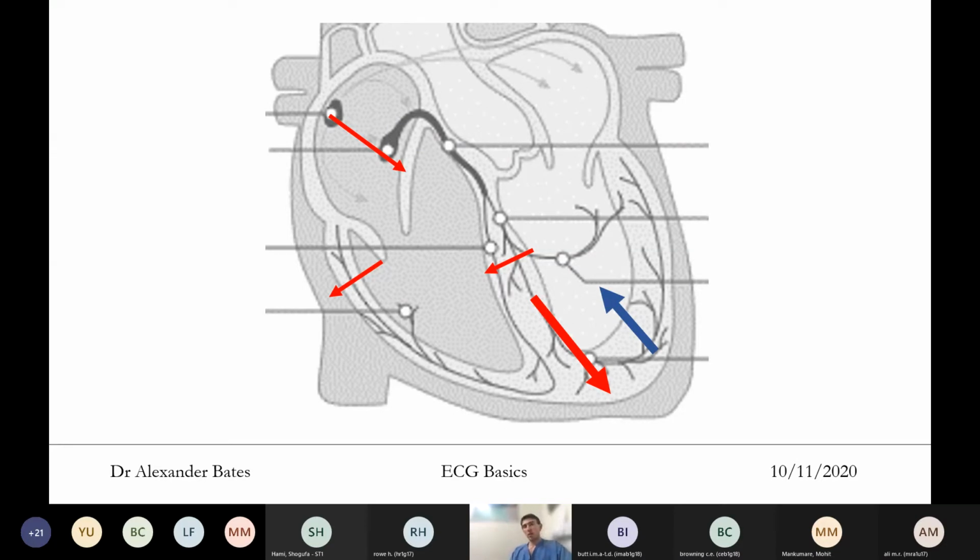So if you're having a progressive change in the amount of hypoxia, anoxia, and cell death within the heart, then you'll be able to detect that on an ECG as it progresses. So you might get a T wave that's inverted, and then more inverted, and even deeper and inverted. So basically your changes, if they are dynamic, represent ongoing ischemia. That is very specific for ACS.